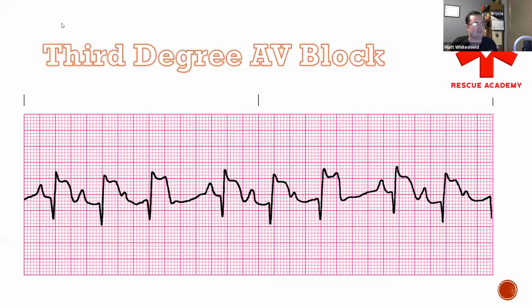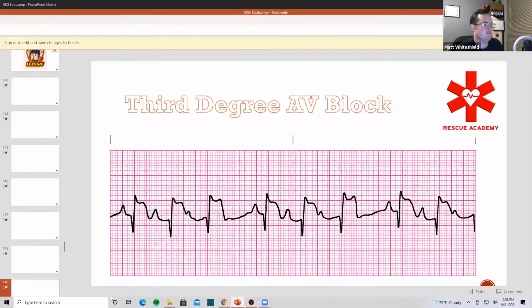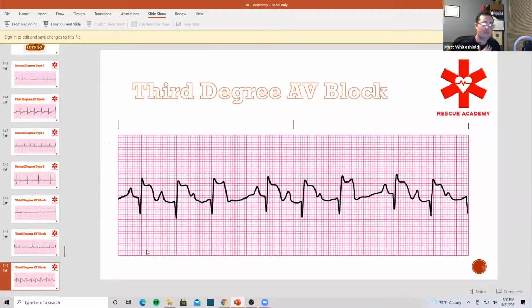All right. Again, these would be the P waves. Let me go in and close this again. If I was the one testing here and I had another sheet of paper that I can use, this is exactly what I would be doing. I would grab that sheet of paper, put it over my test, and mark this one right here, this one right here, and then this P wave right here. Those three would be the ones I would mark, and I would just slide my paper across this EKG, seeing that those P waves line up with other P waves.